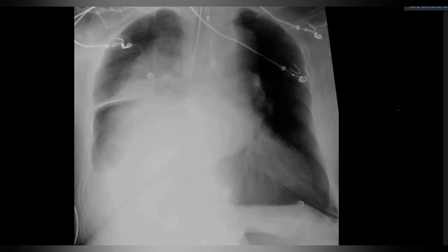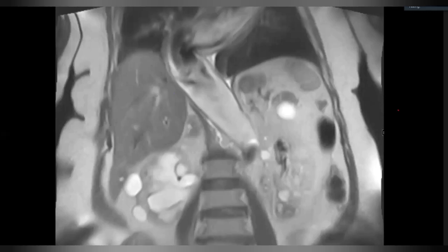Right. So you've asked for something. Here was something done a few years ago. Okay. So what study is this? So these are the coronal MR images. These are T2 weighted images involving the lower chest and abdomen, showing, to me it appears to be a dilated, kinked and dilated thoracic and descending aorta with the flow voids at the level of the kink towards the right.